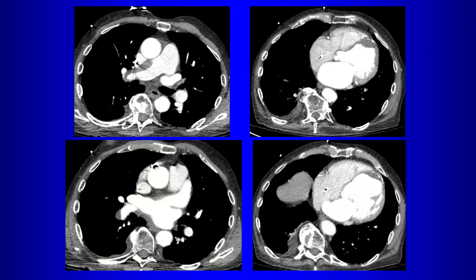Yes. Anything else? What about the heart? Possibly a thrombus there? Thrombus where? Right here in the left ventricular apex. There's this area of low attenuation that represents what? What did you say it was? Secondary to what? What's the predisposing condition? AFib, thrombus in the left ventricle? Or a thrombus post-MI. Is there evidence that there has been an MI here? Well, you mentioned thinning of the interventricular septum, right? What do you notice about the apex?